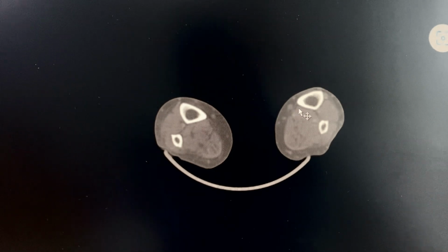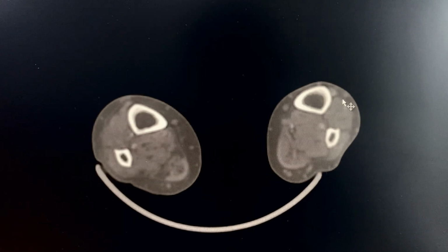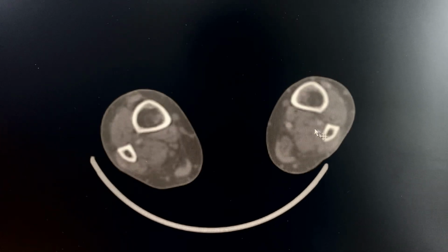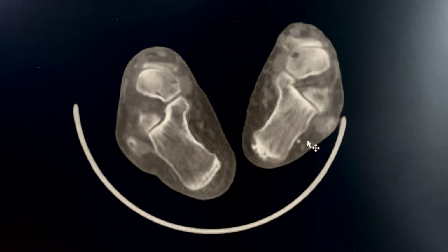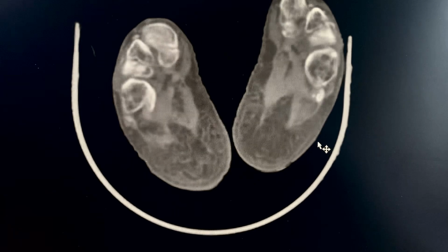All right. So this is your great saphenous vein, but then this is your posterior tibial artery, and this is your peroneal artery, and the anterior tibial artery is right there. So the anterior tibial artery is occluded. The peroneal artery is occluded, but with some open segments here and there, as well as the posterior tibial artery on the left. All branches of all arteries on the lower limb on the left are occluded, and there's no pulsation.